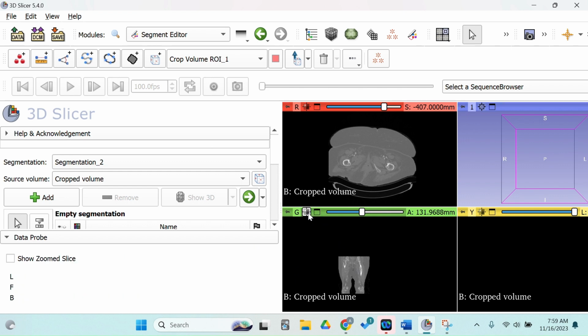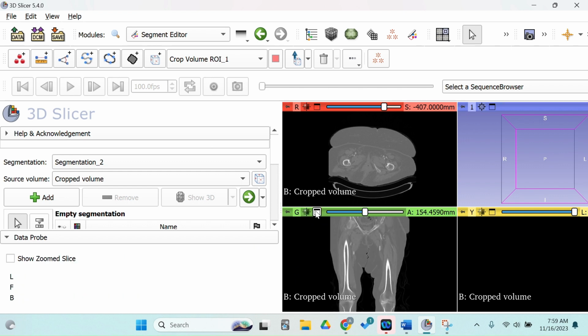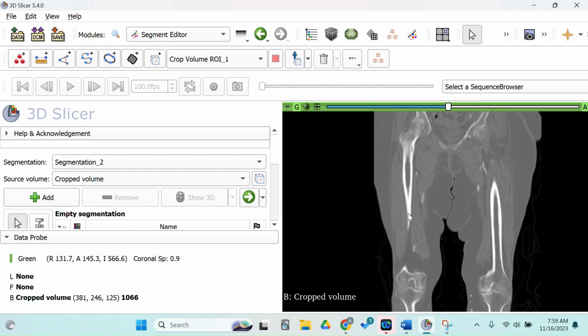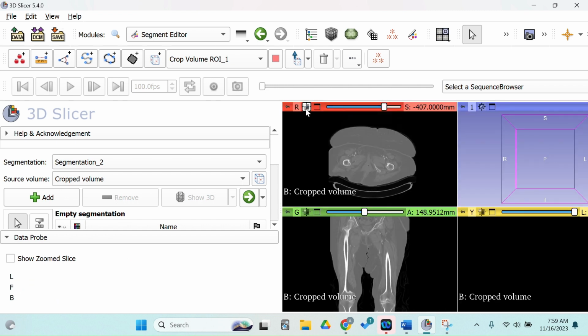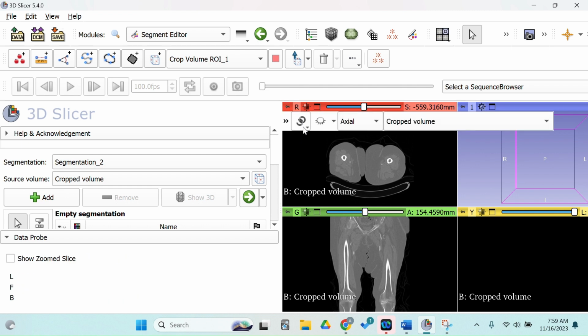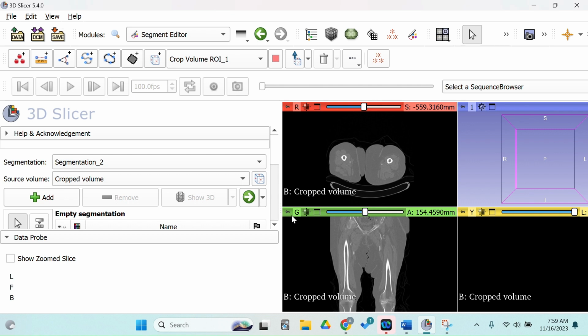So a couple things about navigation here. As I've been clicking on, you can scroll back and forth, zooming in on whatever view you want. This resets you to the middle of the image. Then you can also change what view you have, whether or not you can see that view, whether they're linked or not, as in whether they're scrolling together, which I like to have.